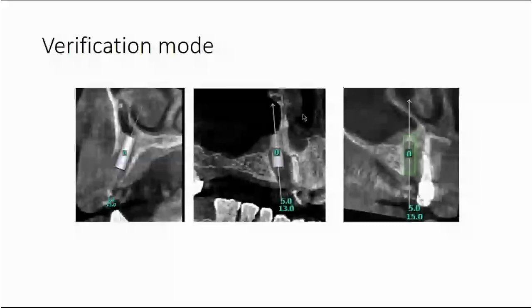And my issue here is to introduce you to the verification mode, which is our possibility to orientate ourselves 360 degrees around one implant. It will help us to assess more data and to see whether all the implant elements are feasible to be done.